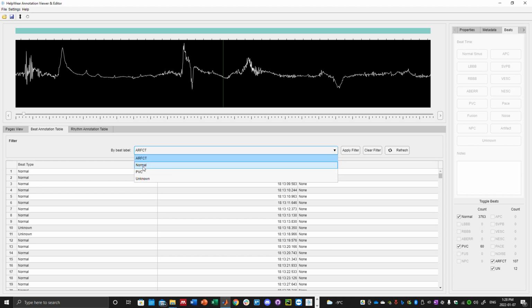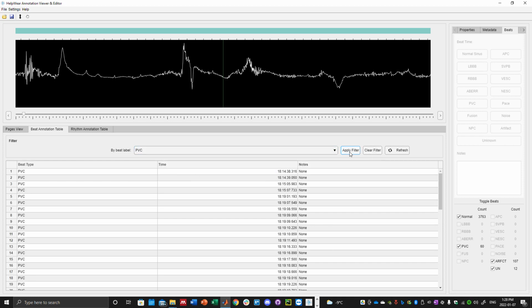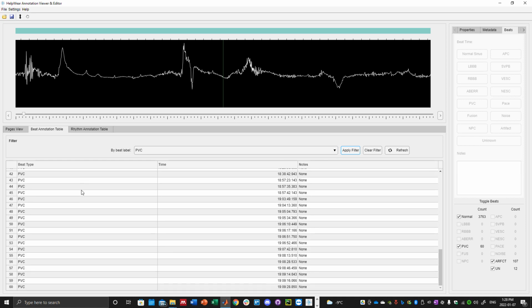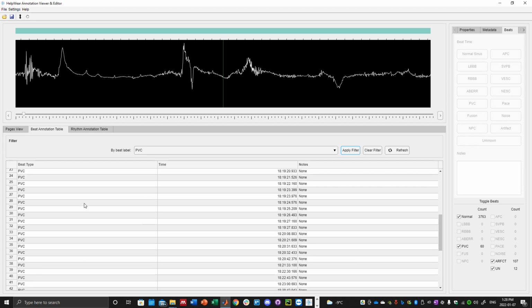You have artifact, you have normal, you have PVC, and you have unknown. We want to look for all the beats that are considered a PVC. So you then select PVC and apply filter. This tells you all the beats that are being labeled as PVC beats.